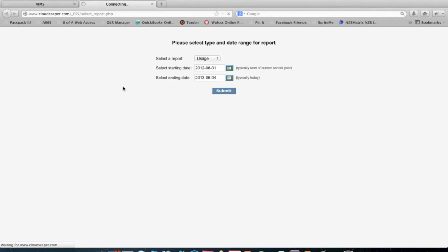The reason this report is taking a long time to generate is probably because I'm doing a demo, but the reality is that it's rolling up all of the hundreds of thousands of vision screenings that are in our database, rather than just looking at a particular user, like a particular school or vision screening organization.